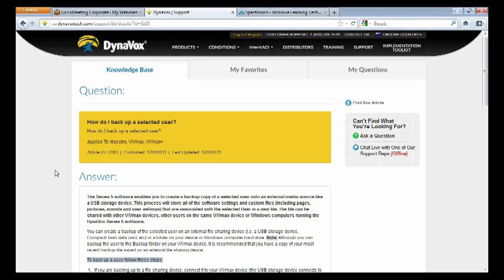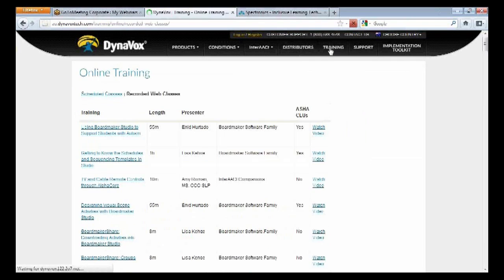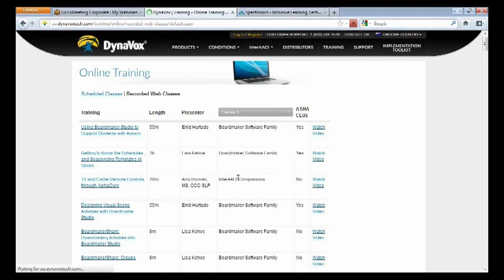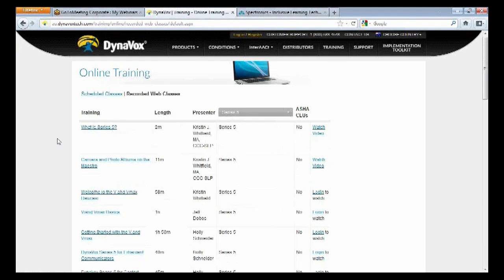The other thing that you have access to is web-based training. So you're watching a webinar at the moment that we've pre-recorded. DynaVox have also pre-recorded a number of webinars. So if you go into their training tab, and you'll see the online training, they've got some scheduled ones and they've also got some recorded options. These are the recorded ones. What we might do is just click on show all trainings and check the ones that are about the Series 5 software. And you can see there's a number that you can watch there.